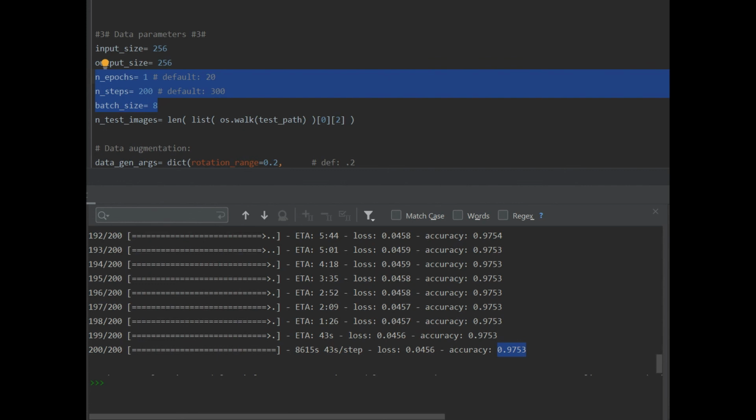Ideally you want to have many epochs because you have to expose the network to all the images several times, so it gets exposed to all the augmented database that is probably really huge. These are good results, of course, but these are training database results. So if we use new images now, perhaps the results drop down a little bit because of overfitting.